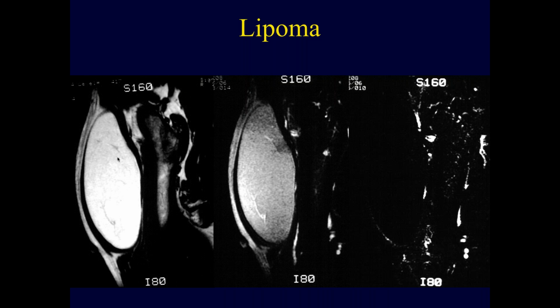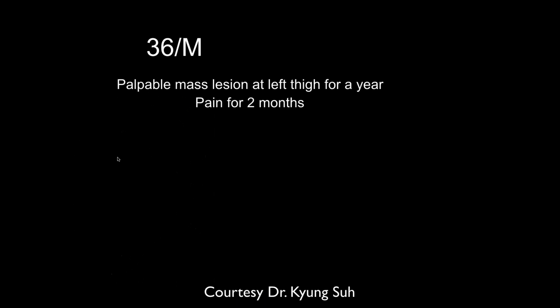I've frankly never seen a malignant lipoma, but I've seen them on slides. And I think you probably described these, John, with large septi, et cetera. Yeah, well, I'll show some more malignant ones in a minute. Okay, let's see. Did you do the last one?